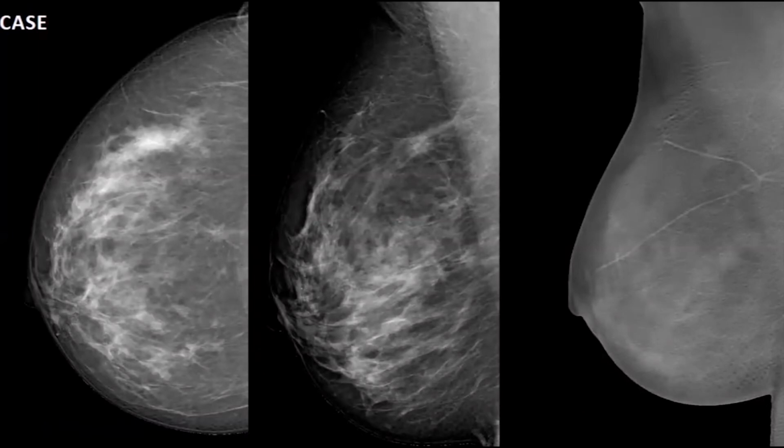This is also a nice case I did, let me say, 4 weeks ago. It is a case where, as an examiner, you might notice this tumor in the no man's land. So there's a heavy distortion. You see it also on the OBL view.